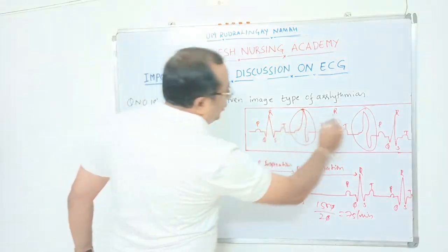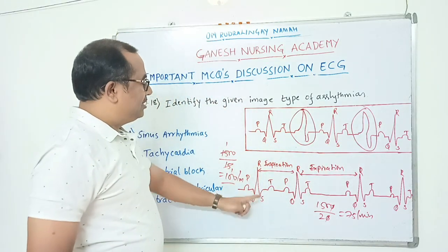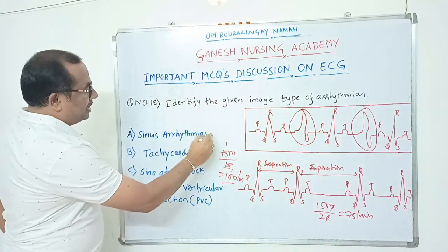Here we are not able to see such kind of changes. So it is not sinus arrhythmia.